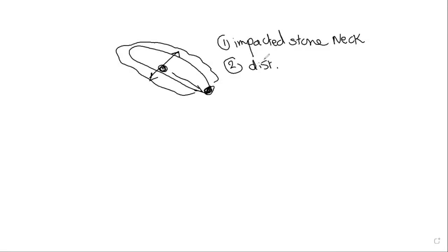Of course, we have to quantify this distension, like the width being more than 4 centimeters. If you remember from the first part, we said that the dimension of the gallbladder is 10 by 4. Absolutely right, 10 by 4. Now, the width here matters, and it has to be more than 4 centimeters so we can consider it distended.